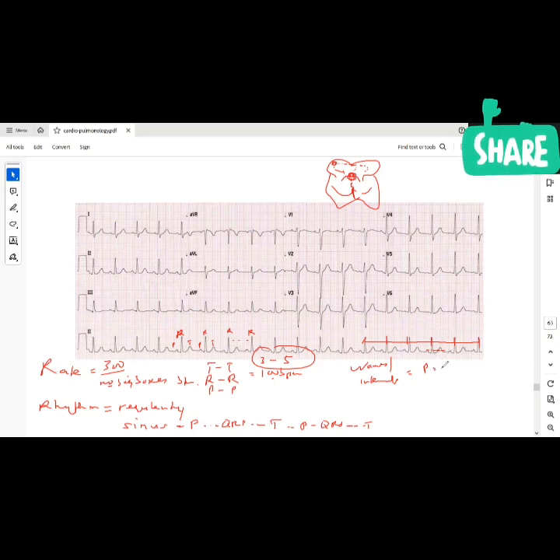And then the PR, look at your PR interval. So the distance from the beginning of the P wave to the beginning of the QRS complex, right? That distance should be what? Usually less than one big box. And remember, a big box is what? One small box is 0.04 seconds. One big box is 0.2 seconds. So my PR interval should be less than one big box, less than 0.2 seconds.